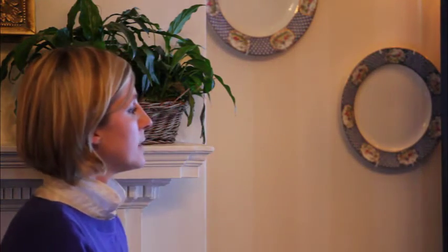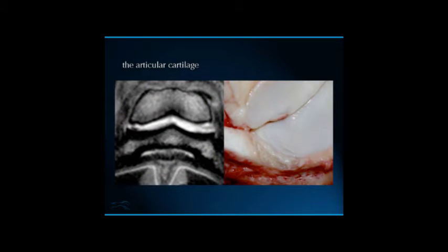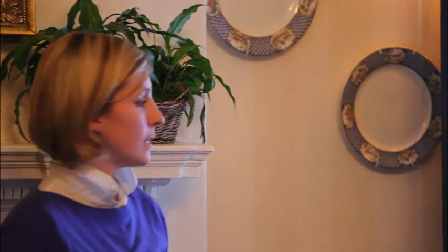When you have this type of appearance on a low field image, you can be quite certain that there is a problem there, and some people would disagree with that, but it depends on how thorough you've been investigating if that's true or not. And these tiny little lesions here, this is a fissure on the articular surface of P3 here, and if you really get your slices nice and thin, you can even detect these tiny fissures. How relevant they are to the lameness is another matter, but what we need to do is be able to know exactly what's going on.